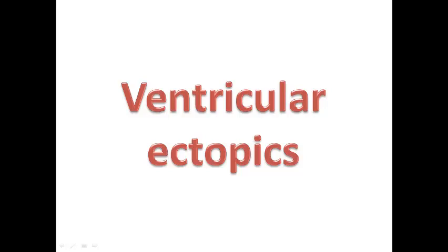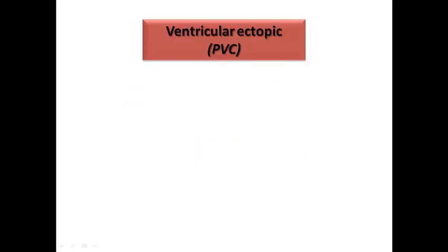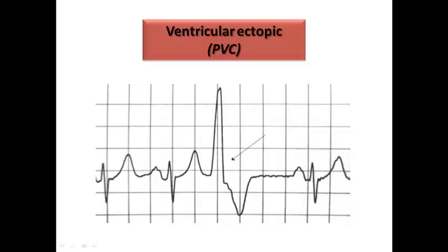Now we have finished the supraventricular ectopics, and we can move to the second part of our lectures, which is the ventricular ectopics. Regarding ventricular ectopics, as we can see here, there is a bizarre shaped complex in this ECG, which is characteristic.